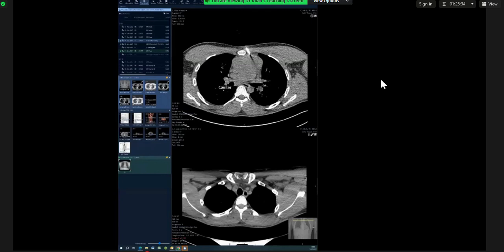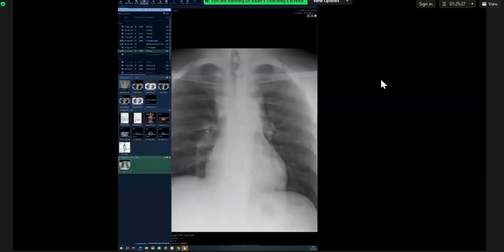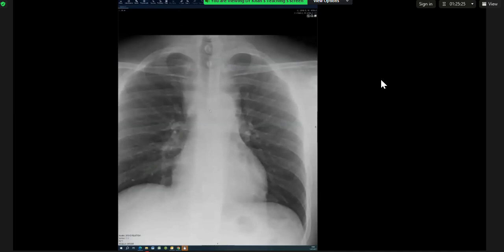Sorry, what was the thing you said on the chest radiograph, how to maximize the points? You said something about the apex. It was for posterior mediastinum. You usually see them tracking up. So this one is very lucent here. Then you didn't say smooth margins. If it's in the lung, not in the mediastinum, the margins aren't that smooth. This is quite smooth. The density is soft tissue, but there is no calcification.